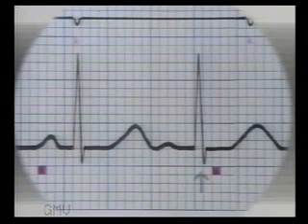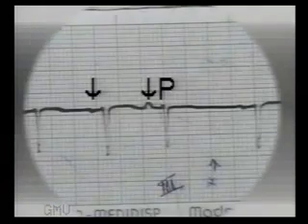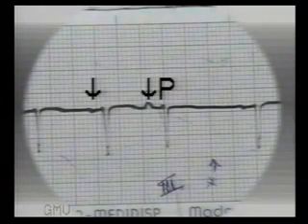When the QRS complex of the premature beat has normal configuration, the beat is supraventricular. Its site of origin can be determined by studying the P wave. In this premature beat, the P wave is similar but slightly different from the other sinus beats. So this is an atrial premature beat. Note the upright P wave slightly altered in an atrial premature beat. The PR interval is normal. In this ECG, the premature beat shows an altered P wave different from the regular sinus P waves. So this is an atrial premature beat.